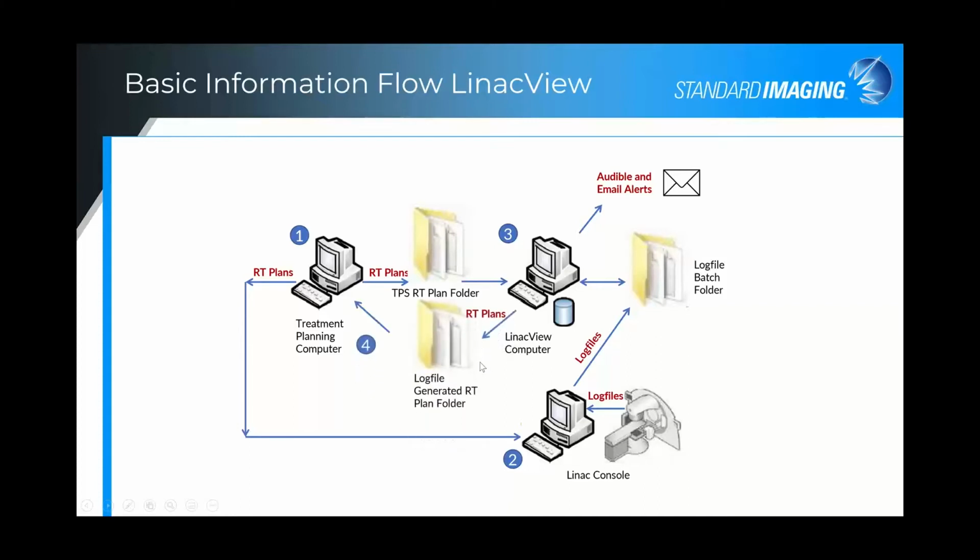In addition, I wanted to mention that LinacView can also export RT plans. That can be done manually on a case-by-case basis, or one can configure that to occur automatically so that the log file generated RT plans occur with each and every fraction delivered. And then one can set up in their clinic different workflows if they would like to send those RT plans via a scripting mechanism back into their treatment planning system.